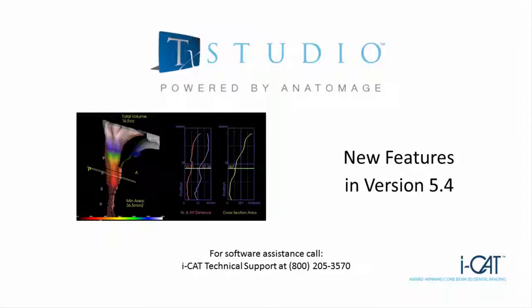Treatment Studio treatment software is included with new iCat Cone Beam 3D scanners, giving general dentists and specialists the tools to place and restore implants, perform oral surgery, periodontics, prosthodontics, orthodontics, utilize CAD/CAM applications, and analyze TMJ and airway with greater confidence and lower radiation options.